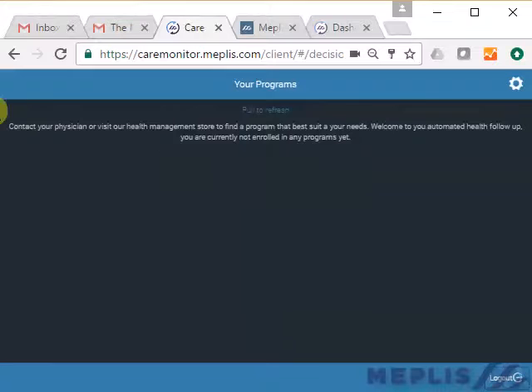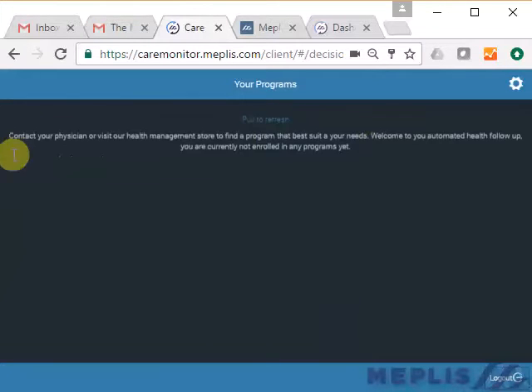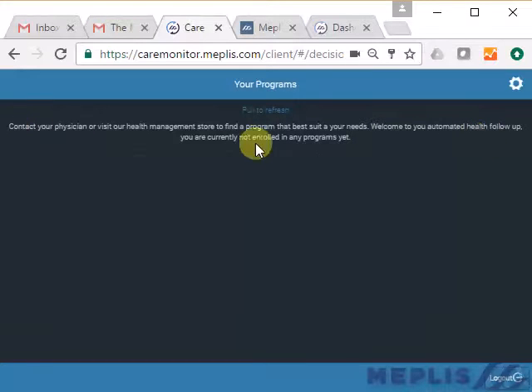So now I am back on my dashboard and you see that there's no follow-ups that I need to complete. So basically, I've done everything that is expected from me from my different organizations that enroll me in follow-ups, and for now, there's nothing for me to do anymore. So that's great. Tomorrow, I will receive a new notification by email or by push notification if I use a mobile app to take action and to execute my follow-up program again. But that's great. So that's done for now.